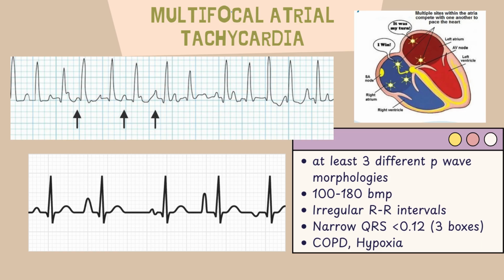And in all of these foci shooting, we'll have a random QRS that's caught through the AV node and gets sent out here and there. So we have an irregular, narrow QRS, but unlike atrial fibrillation, they're still P waves. They're just little weird looking deformed P waves and chaotic in its origin. But I really like multifocal atrial tachycardia. It's not fun for the patient, but it's really cute on EKG waveform.